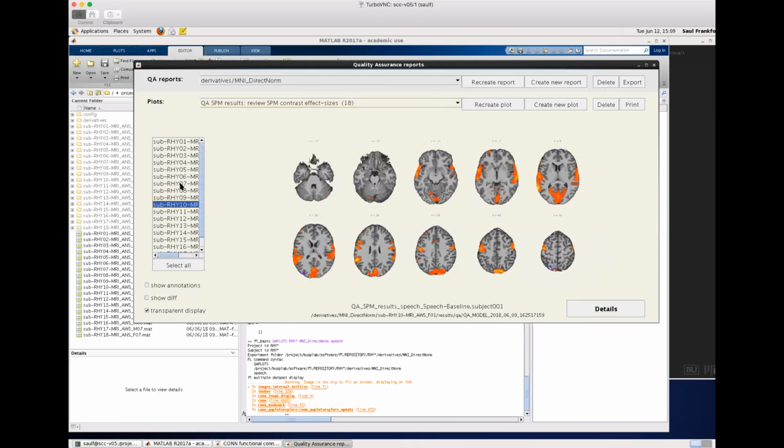Let me see. In here, you're seeing a little bit of negative activation that shouldn't be there, but it's not terribly worrisome. In this case, you're seeing biases towards the positive numbers. Sorry, number 10. So you are probably seeing a little bit of positively correlated motion-related activation, but it's still small because you can still see mostly true activation, so that is probably fine.